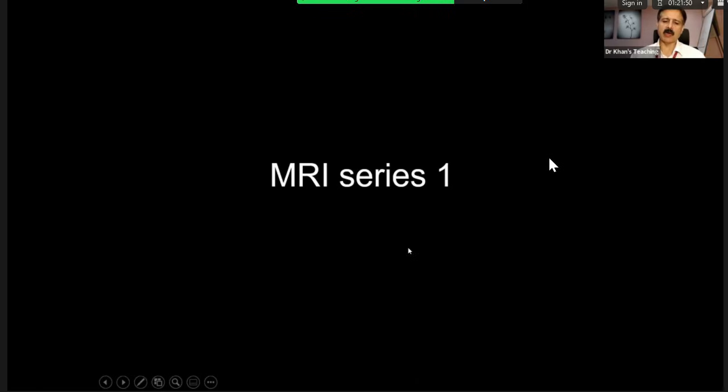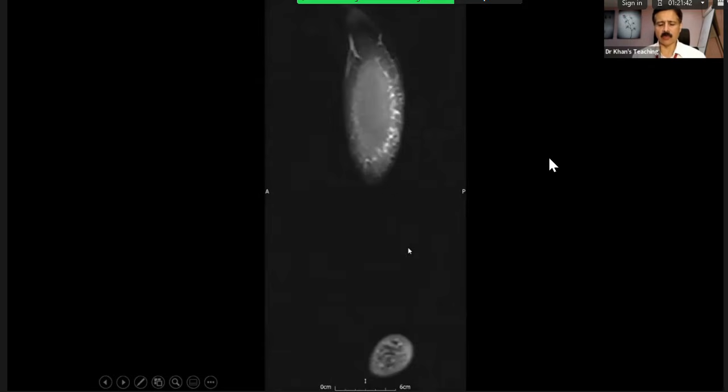Okay, so this MR, you can scroll through it. Let's see if it works. It's in a PowerPoint mode, but the images will come one after the other.